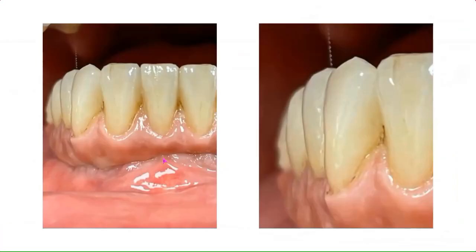Before we jump over and start to get into more of the technology that's involved and then into the software, I just wanted to share with you some results that we can achieve with the NobelProcera implant bridge. This was a case done by a master ceramist, Sean Hahn. He's one of our KOLs at Nobel Biocare, a master ceramist, and you can see what he does here with these zirconia bridges. He's a very, very talented ceramist, dental technician.